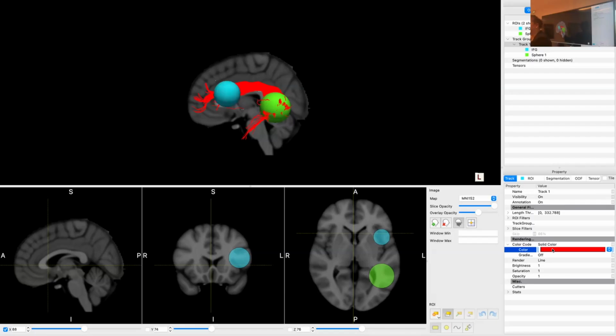If you use spherical deconvolution, so you can resolve crossing better, you're going more anterior. That is because you can resolve the crossing in Broca's area with the fronto-aslant tract and the corpus callosum. Now, where exactly the tract goes, we still don't know.